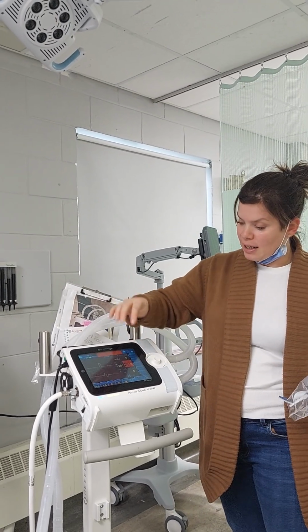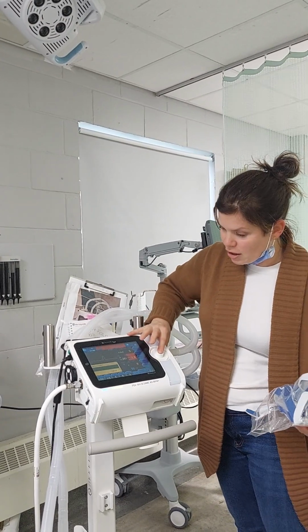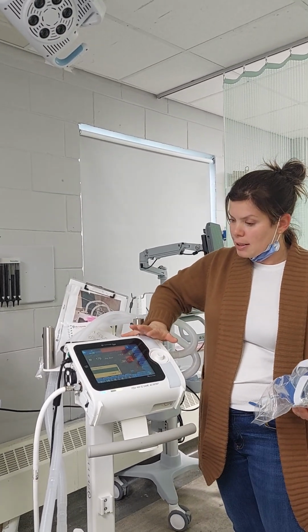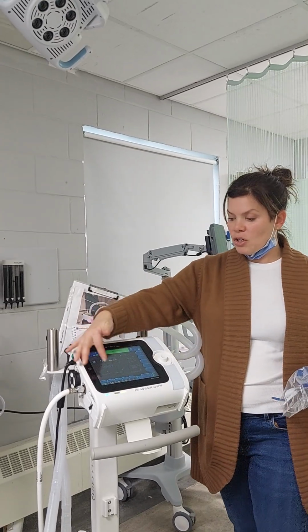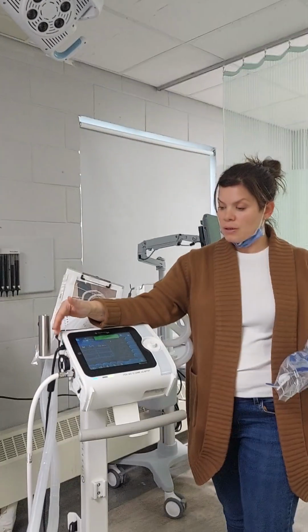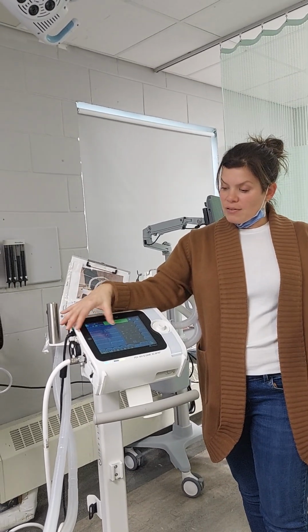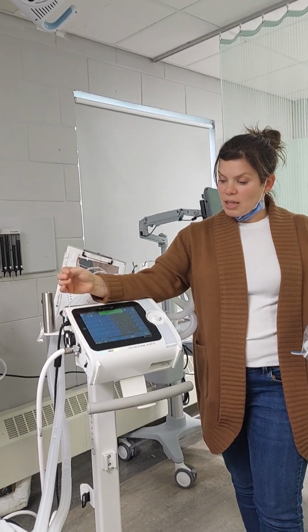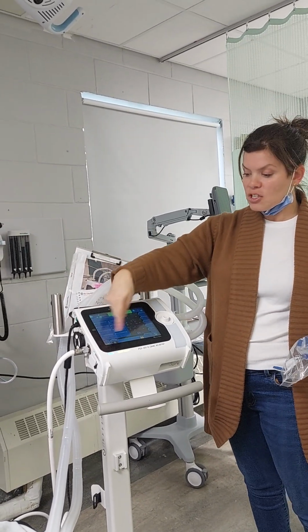So the PSV, NIV. If we go back to the home setting, you can go from right there, but we'll just stop it. CPAP. Once you're in here, all your other options are in ventilation modes, and you'll have a non-invasive and an invasive that you can do, but CPAP is just right there. That's just your inspiratory pressure and it's just two settings.